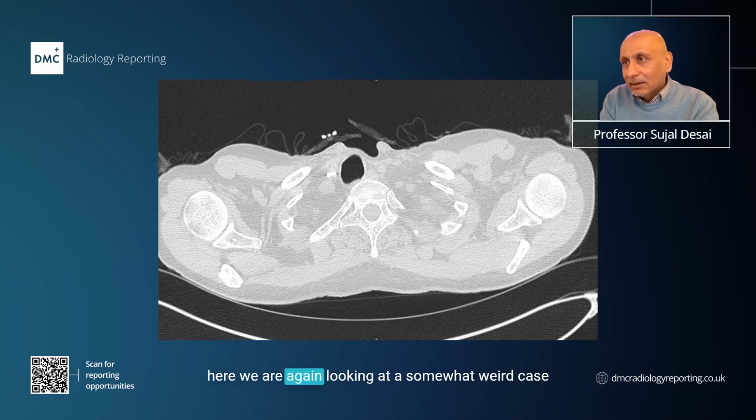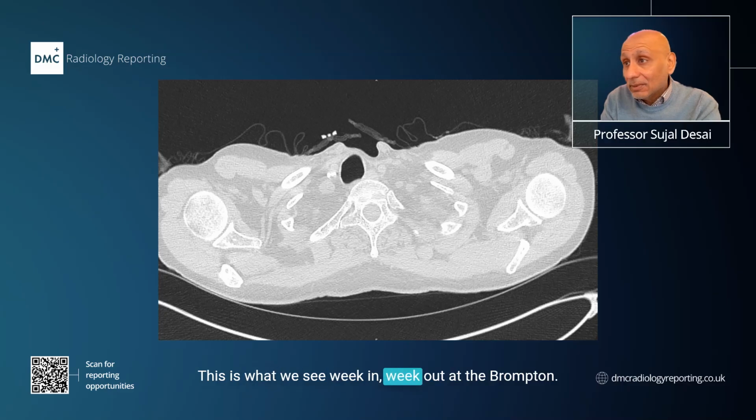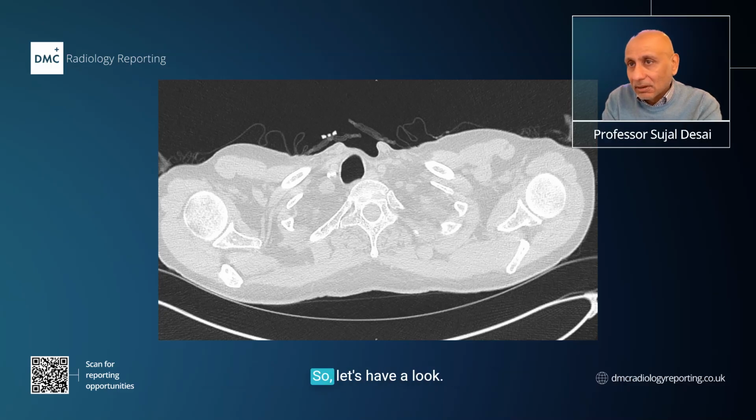Folks, here we are again looking at a somewhat weird case in the world of diffuse interstitial lung diseases. This is what we see week in, week out at the Brompton. So let's have a look.